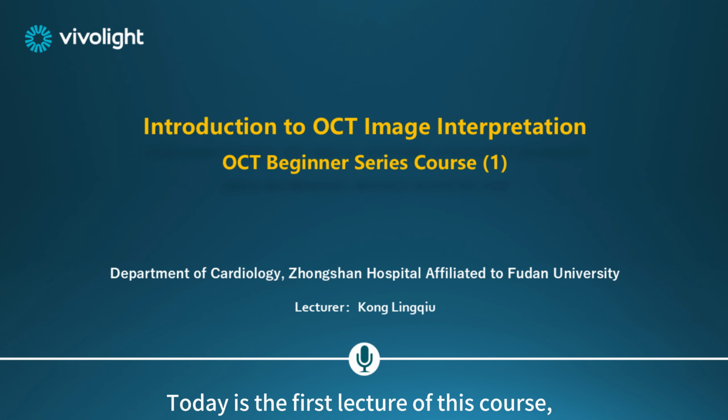Today is the first lecture of this course, where we will introduce optical coherence tomography and the image interpretation.